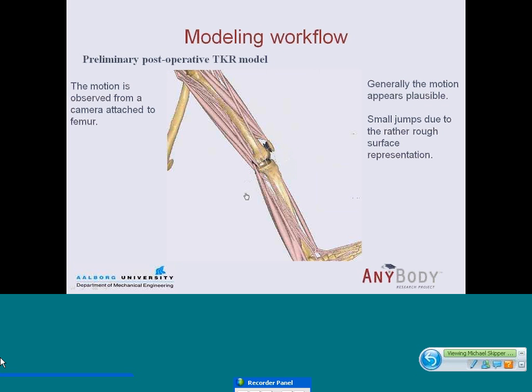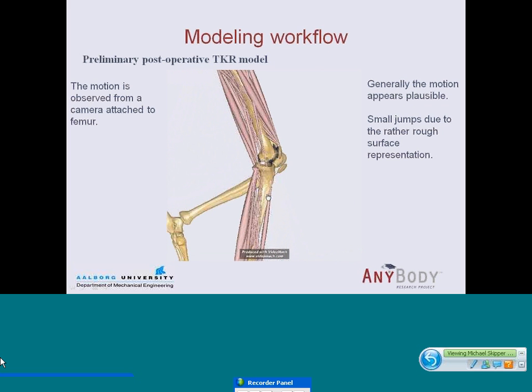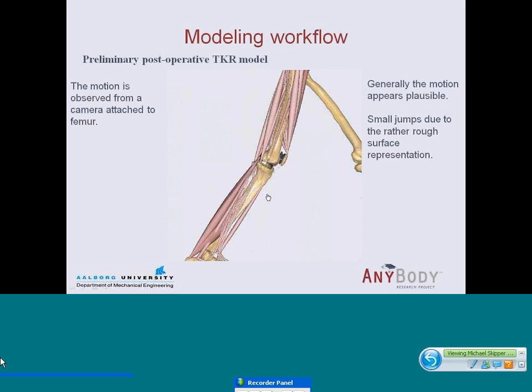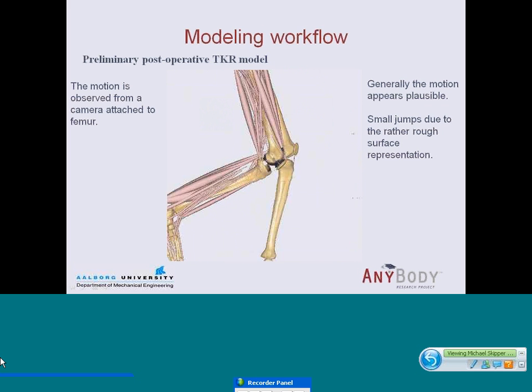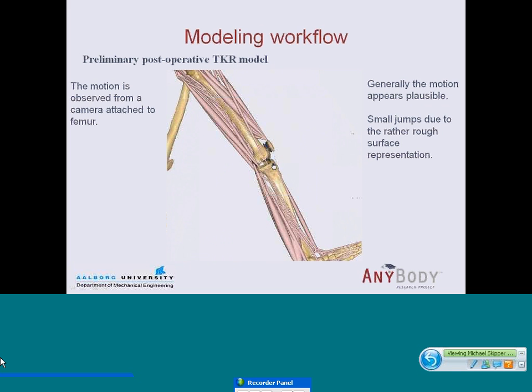So if I run it again, then you should be able to see this. So right around, it takes off now. There's lift off here on the lateral side, and you see a little bit of jumping of the patella on the model.